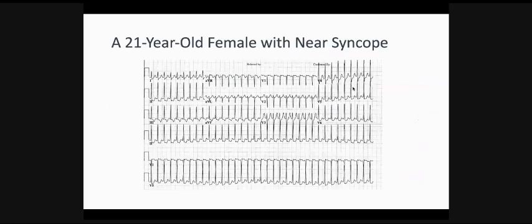A 21-year-old lady with a near syncope. Let's get this and see if you will get into the trap here or not.